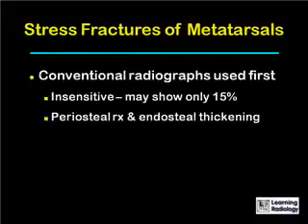Conventional radiographs are almost always obtained first, but they are relatively insensitive, especially early on in demonstrating stress fractures of the metatarsals. Within the first week, they can show only about 15% of all stress fractures. When they are positive, they demonstrate periosteal reaction and endosteal thickening.